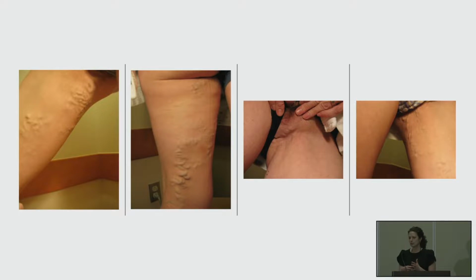So you need to be able to see where these veins are coming from. You might not even be doing a pelvic reflux study, but you can tell your provider, hey, there's something more proximal going on here because I can see these trickle varicose veins within the legs. That is a pelvic source varicosity. It's hugely important to identify these veins.